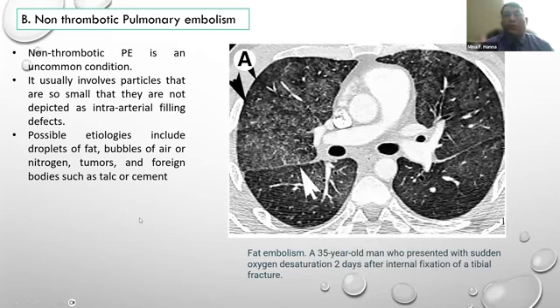It is very common, especially in the first or second year of residency, to have a question: I want to check if there is an air or fat embolism. Air embolism may be very small, you can see it. And fat embolism, actually, is sometimes a wrong concept. You think about fat embolism as a filling defect in the pulmonary artery, which is wrong, especially in a patient with femur fracture coming with tachypnea and tachycardia, and they ask you to check for fat embolism. Fat embolism presents not with a filling defect, but with patchy ground glass opacities in both lungs, something like this.